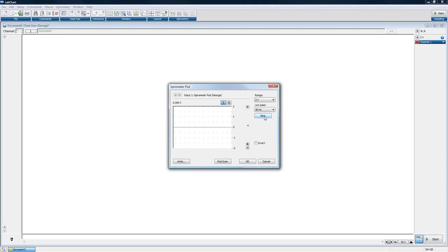So if you're using a third-party spirometer, chances are you're going to have to go here and record some flow data, bring it in and see, okay, yeah, we're well over 50% of the total range. That should work well. Or we're under, so we need to drop our range down a little bit more. Normally with our front ends and the extension, everything works pretty well, but it's always good to go in and validate and make sure we're recording correctly.